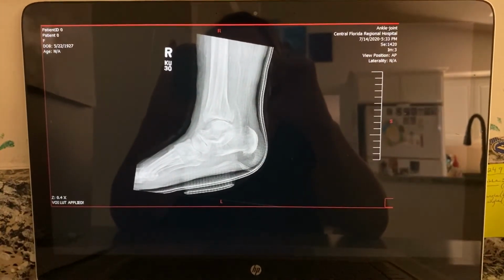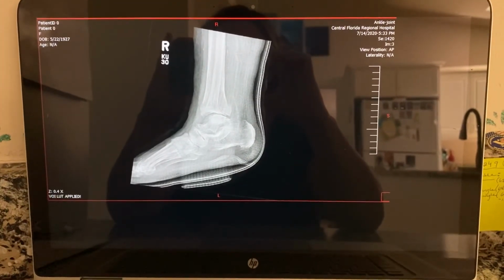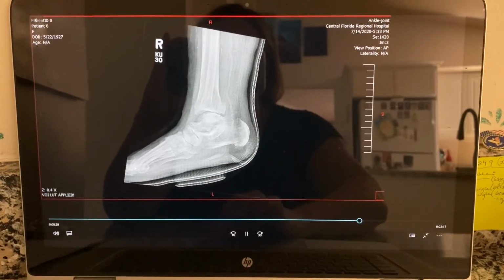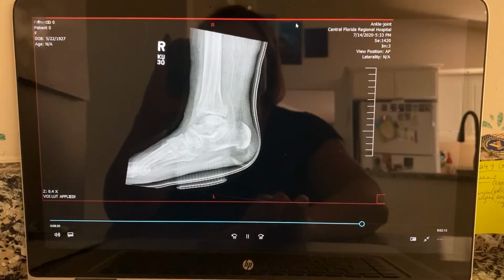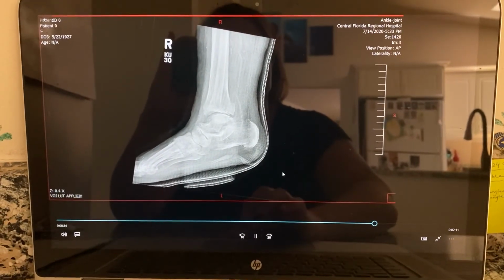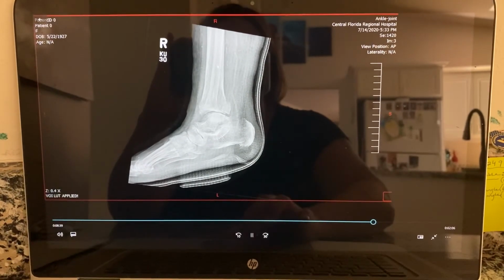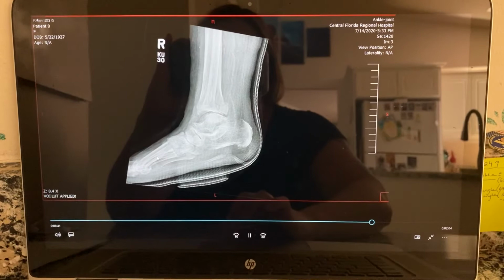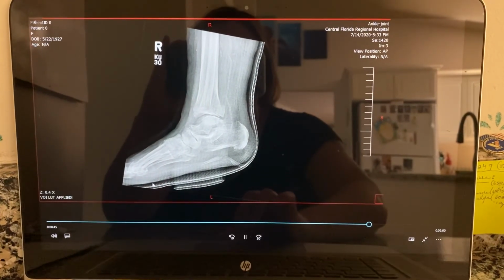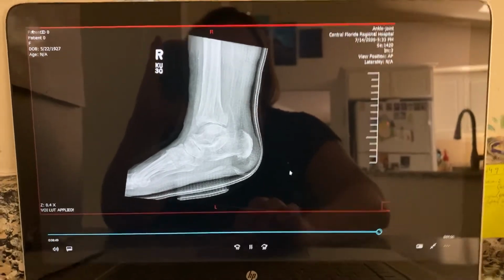Patient was rolled to her right side and positioned with a wedge sponge under her left hip this time. Collimation is present to the lateral margins of her ankle to include the distal tibia and fibula and proximal half of her metatarsals. Again, collimation could have been slightly tighter by another inch or so. Again, because of angulation, I wanted to ensure to include all anatomy.